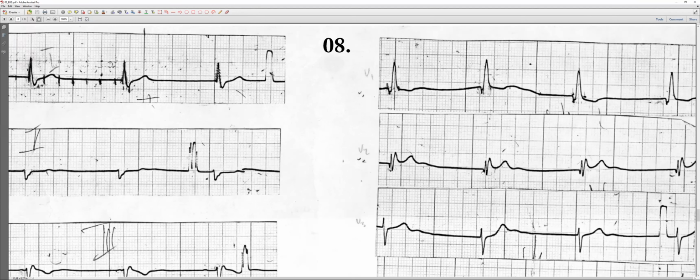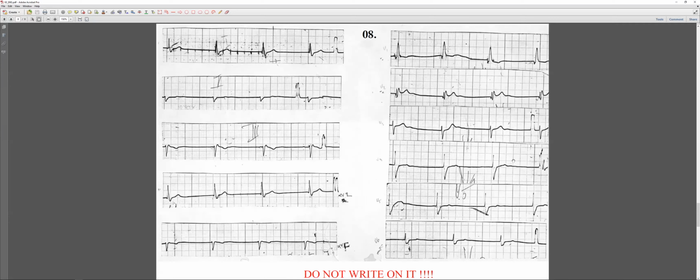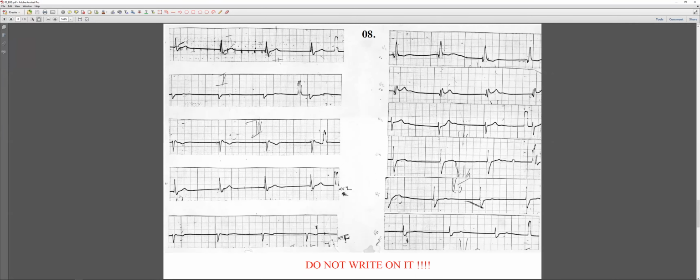So I think subacute. Do we have ST elevation? How big should the ST elevation be in the chest leads? It should be around more than 2 millimeters, and we do not have more than 2 millimeters. Yes, it's only 1 millimeter. So that means it's a septal MI, it can be an old septal MI. Okay.